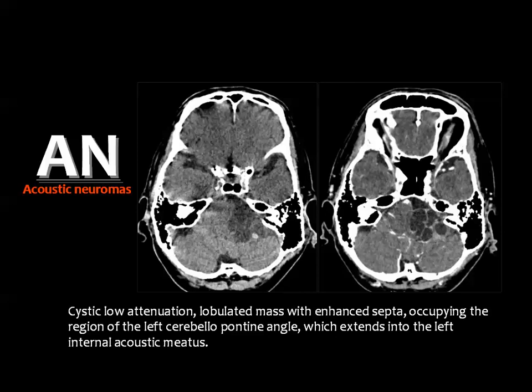You know that epidermoid cysts do not enhance, but if it is infected or has some inflammatory reaction, it may show marginal enhancement. And at that time, you need to separate both, and you go to the diffusion weighted images.